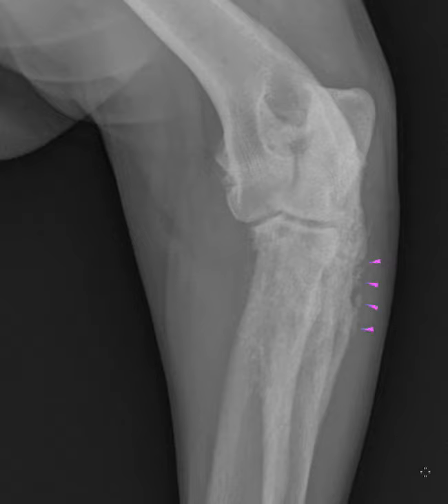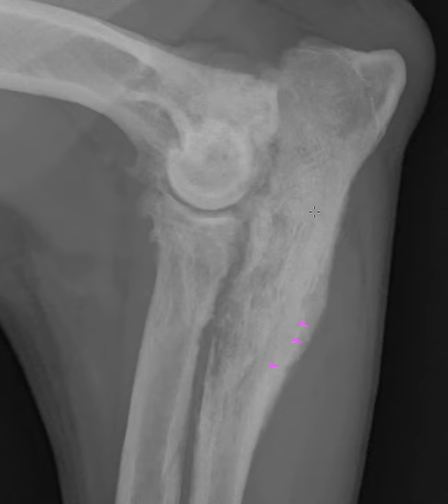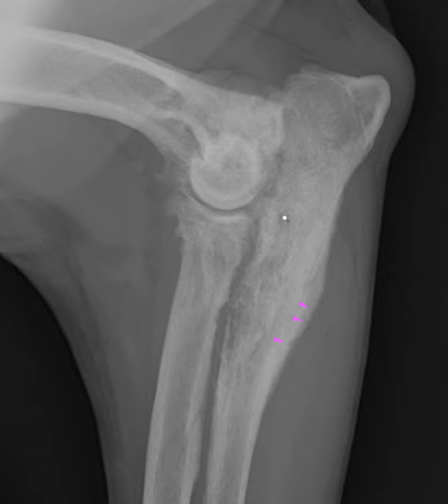It in fact has an appearance of not only being irregular, but I would even categorize some of this as having a slightly interrupted appearance on this view. This view is rather oblique, making it difficult to see all the details as we saw on the other view. But one thing that we can appreciate on both of the available views is that this lesion is centered on this proximal diaphysis of the ulna.